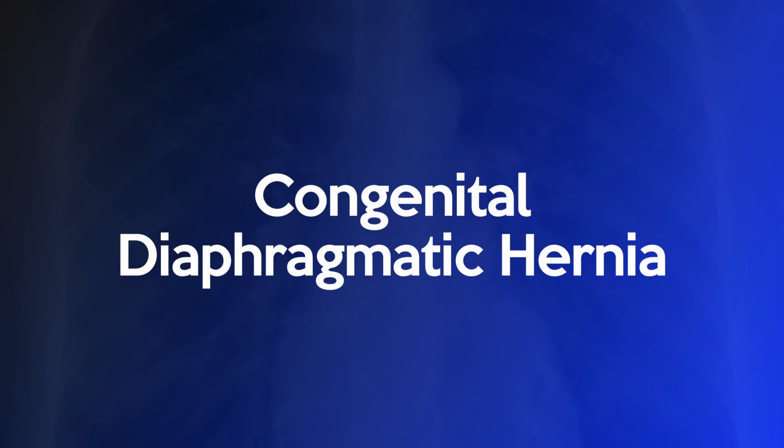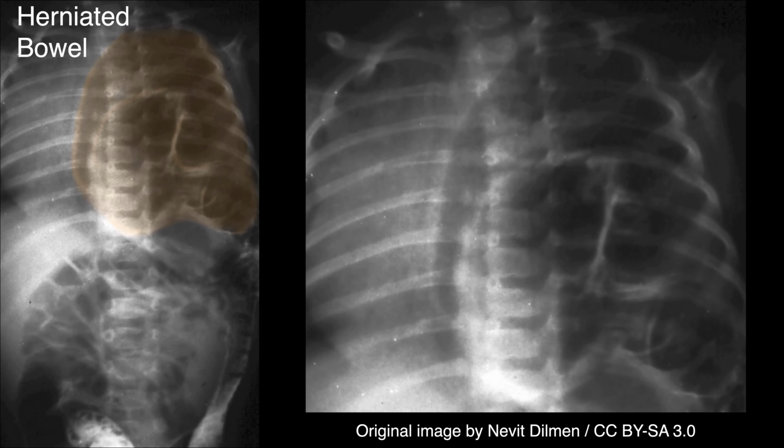Congenital herniation of abdominal viscera, such as intestine and liver, into the thoracic cavity can result in ipsilateral absence of aerated lung and a contralateral mediastinal shift with lung compression. Characteristically, multiple loops of air or fluid-filled bowel are seen in place of the lung. If the herniated loops of intestine are filled with fluid, then the affected hemithorax will be radioopaque.